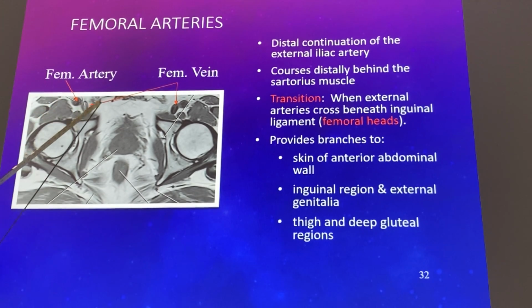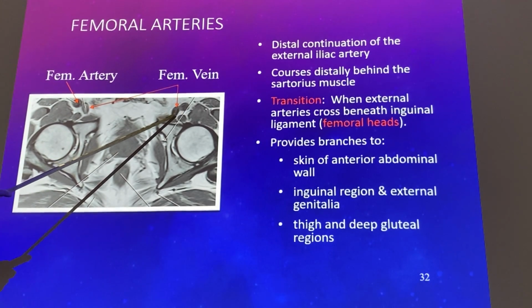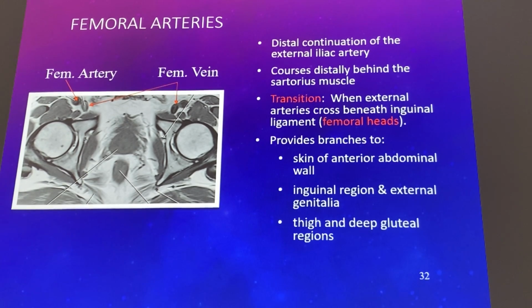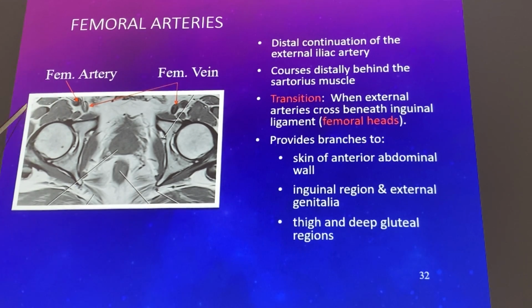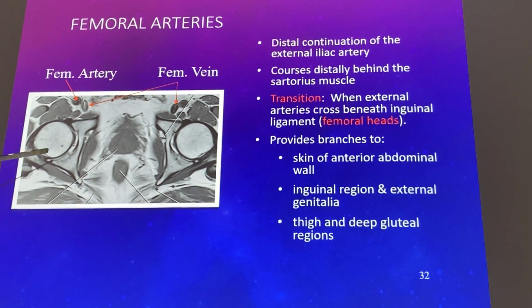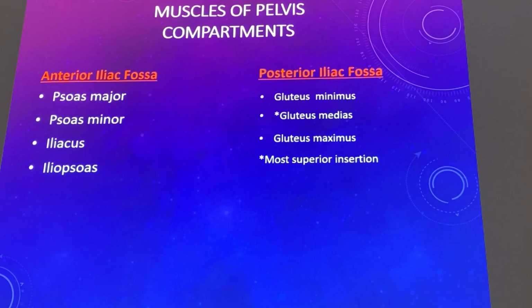We've already passed beneath the inguinal ligament, the larger of the two and more posterior femoral veins. What's anterior to them would be femoral arteries, and again, they're going to continue to move out toward the periphery of the structures. Again, arteries over here, femoral heads over here, and that's where that transition is beginning to occur. Questions on that? We'll look at better examples here in terms of contiguous slices. Hopefully it'll make more sense as we look at it from that perspective.